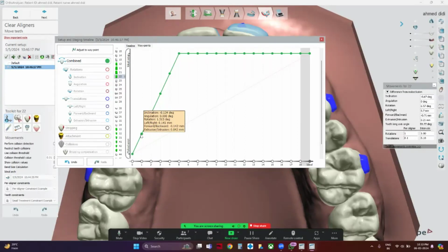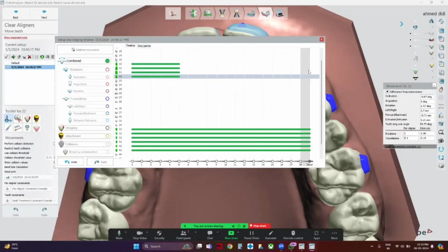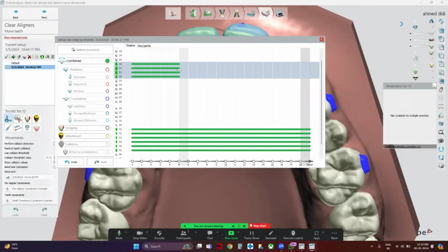So it's not that I have applied some formula over here. What I've done is I've randomly taken it from 19 to 5, and then I went in and calculated whether approximately all my values are within my stipulated controlled values. If they are, that's fantastic. So for example, looking at my 1.5 millimeter limit, I can actually move it to 4 aligners also.